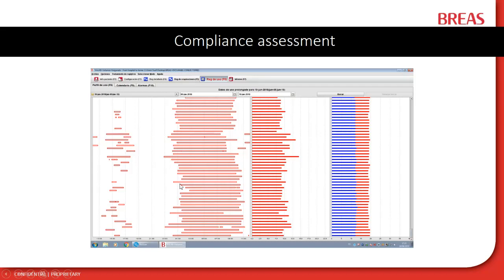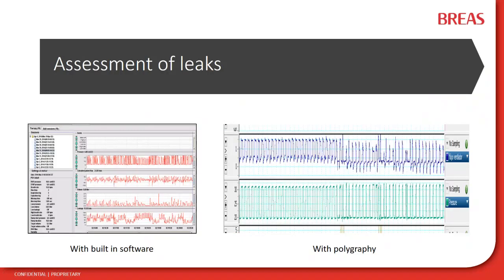For example, this is a patient that uses the ventilator here in the afternoon and during the night, and some nights, for example this one, you can see a fragmented use of the ventilator. This is the first step. The second step would be the assessment of leaks.